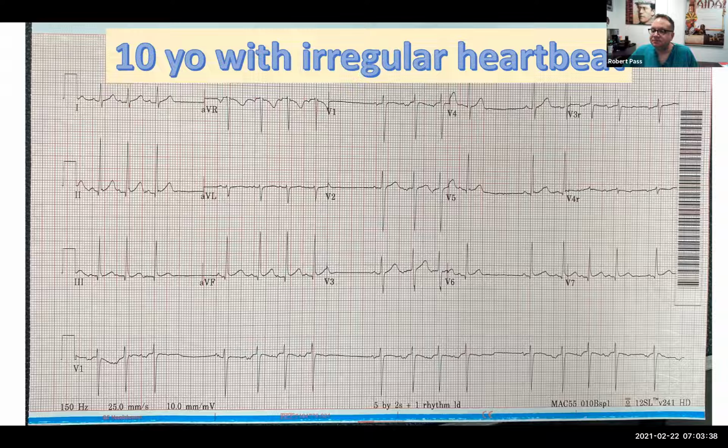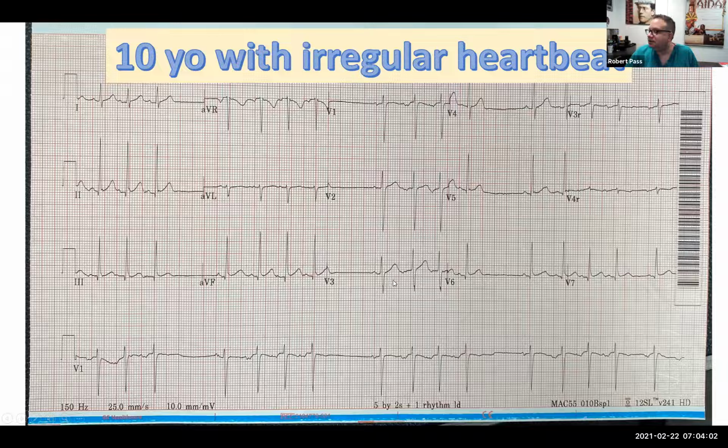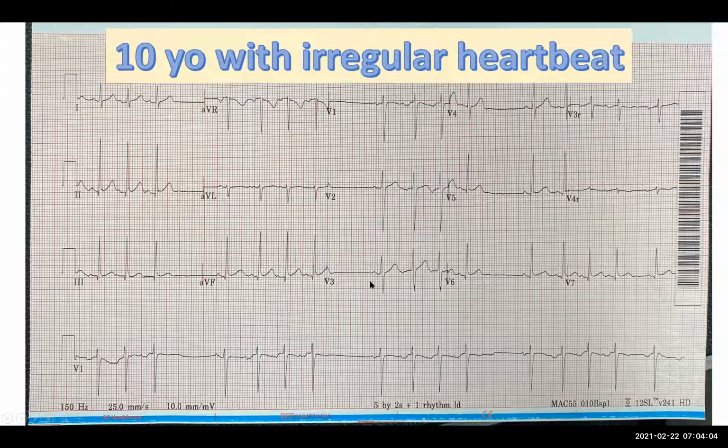I said, I think that there are P waves which are upright. Well, let's look in lead V2. Do these P waves look the same as this P wave? No, they don't. What about in this lead here, V3? No.